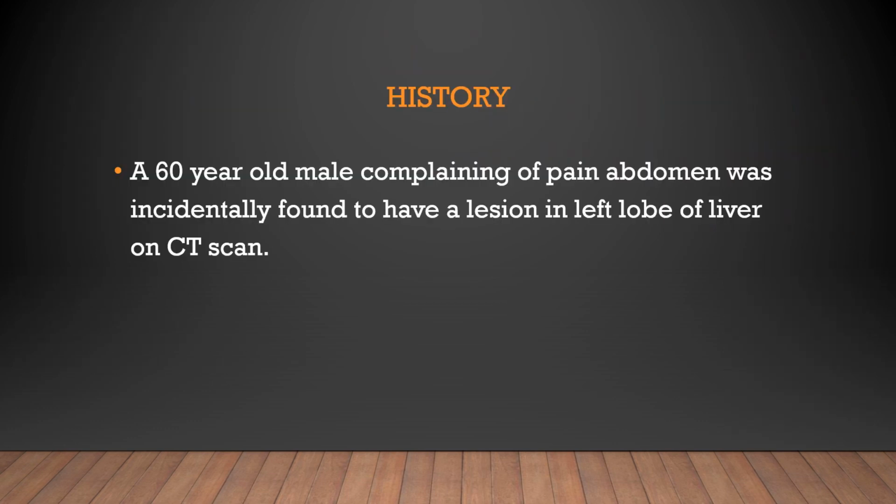Here is a 60-year-old male patient complaining of pain abdomen, was advised CT scan and was incidentally found to have a lesion in left lobe of liver.